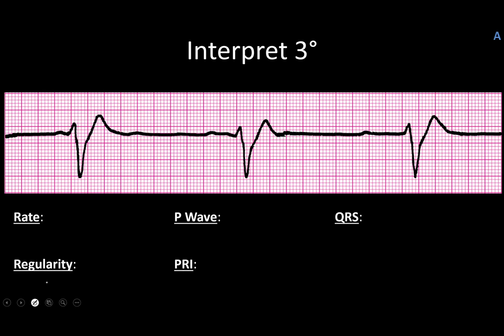All right, this is our final one, and it is also the most challenging. So we'll walk through this as best we can. We'll do everything that we've done before. Our rhythm is regular, no pattern, no ectopy.